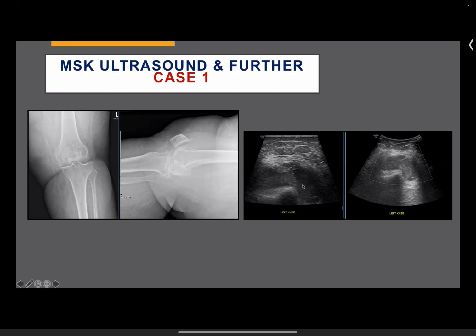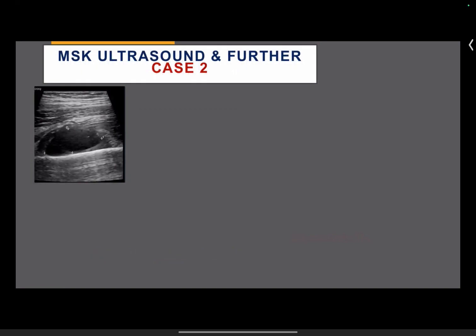The two things that I would be thinking about are is it a hemarthrosis, the patient on anticoagulation, or is it pus? So it was aspirated and that came out as pus. Okay. So sometimes you can't tell on ultrasound, but something doesn't look right. It doesn't look like a clean effusion, right? So again, that was frank pus. It was septic arthritis, and the patient had a washout.